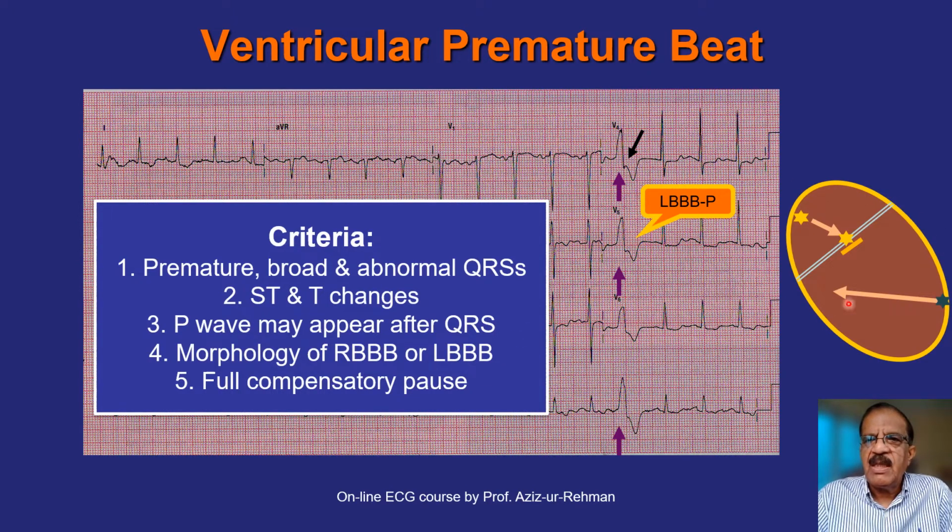So this is a case, not exactly this person, another person. There is an ectopic focus, say in here, the left ventricle apex. This would produce a depolarization wave which goes this way, because this is the side of the myocardium. Of course, it will have to go in the direction of the rest of the myocardium. It will spread in all directions, this way, this way, and this way. It will depolarize the entire ventricle, but the net flow of current would be this one, and that would be shown on ECG, and this would perhaps show as a right bundle branch block pattern.